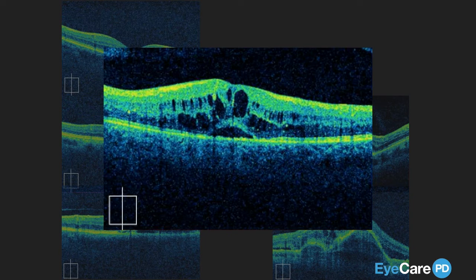Yes, you need to be very careful to make sure you're not missing other pathology. But the point here is that just with the OCT and understanding the importance of the descriptive terms to lead you to the diagnosis, you might be able to treat. You want to make sure that they don't have subretinal hyperreflective material or other signs of other disease. But in this case, you've got a very clear-cut case of post-op CME. Maybe you're going to treat that with topical NSAIDs.